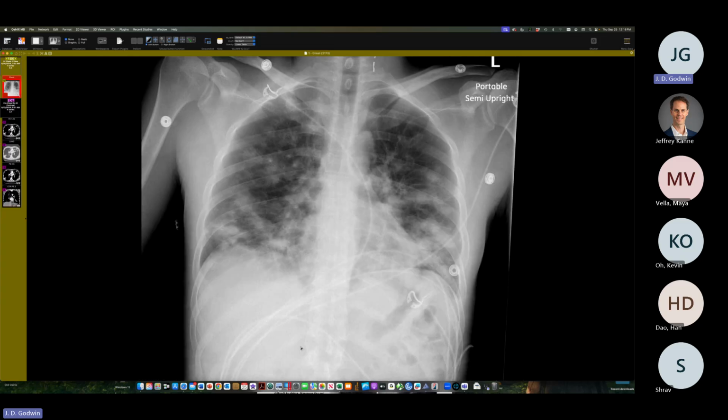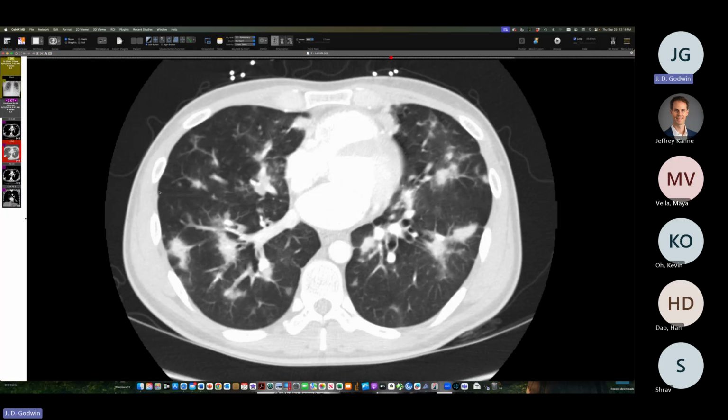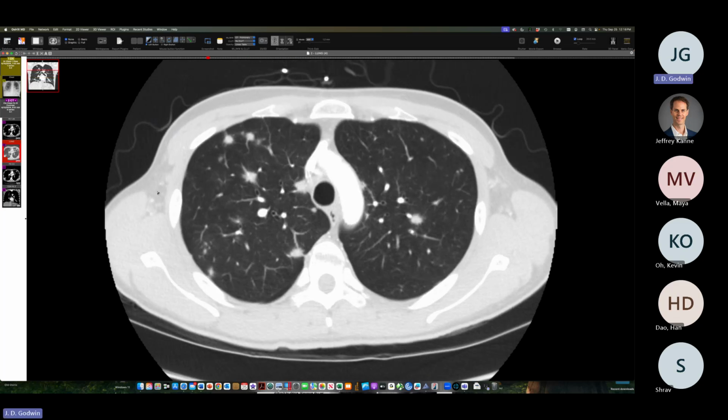Okay, this person had shortness of breath, has a history of losing weight, having some diarrhea, and not feeling well for a few months, worse in the last few weeks, and has these vague lung opacities and fairly low volume. I think this person is around 30 years old. And here's what it looks like on CT. There are all of these sort of stellate, spiculated nodules floating around.